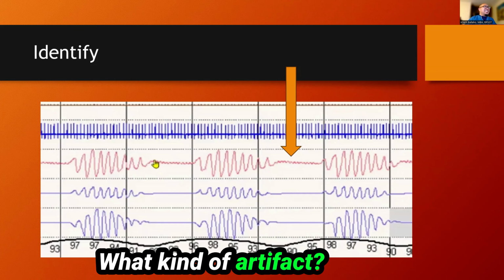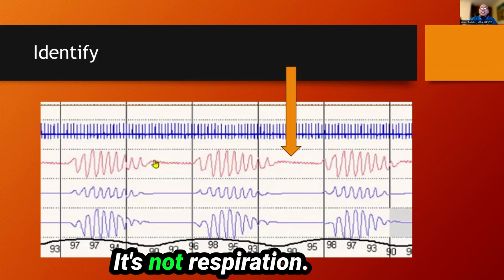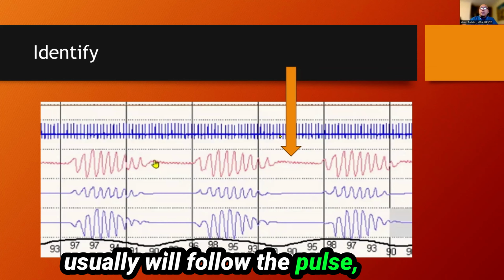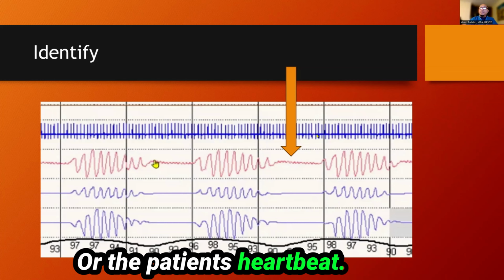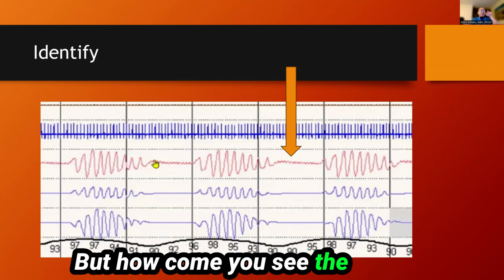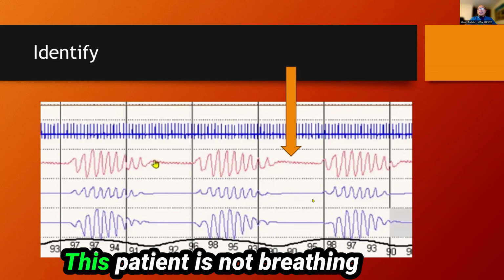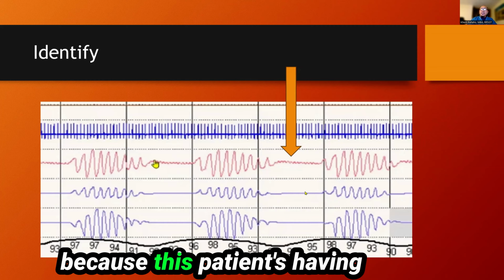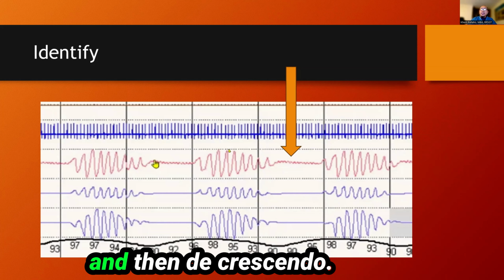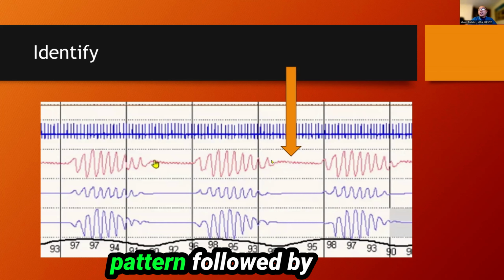What kind of artifact? Ballistic. Cardio-ballistic. I don't know why they term it ballistic. It's not respiration. So this little pattern here usually will follow the pulse or the patient's heartbeat. So there really is no pattern. It's central apnea. But how come you see these squiggly lines, but then there's completely no effort? There's no effort. This patient is not breathing because this patient is having Cheyne-Stokes, because of the crescendo going up and then decrescendo. So crescendo, decrescendo pattern followed by a flat line.